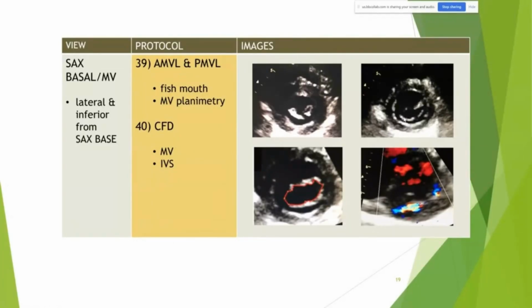It looks open, so I'm going to say diastole. Why? Because the valves are open. Yes, perfect. Mitral valve and tricuspid valve only open in diastole, never in systole.